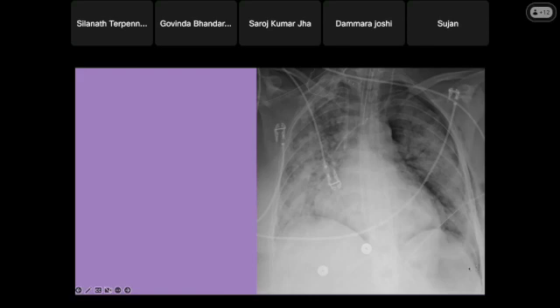So in a supine position, you may not see apical pneumothorax, but instead of apical pneumothorax, you will see this. We call this the deep sulcus sign. So it indicates the patient is having pneumothorax, and we are taking a picture when the patient is in supine position. So we don't expect to see the usual apical pneumothorax in a sick patient. So we're looking for the deep sulcus sign. But for this case, it doesn't matter. He has the chest tube drain here, which may not work well for this pneumothorax, but the chest tube is in there and somehow is draining.